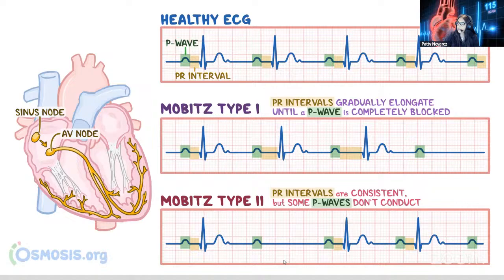However, there is a drop of the QRS. So if this were to start, look at this. We have a regular PR interval, a QRS a little bit wider, and then we have a T wave, and then we have a little U wave in there. But then we move back to the P wave and QRS with this regular interval, and then we have the T, the U, and then there's another drop. So that means here, for every 3 P waves, there's a drop of the QRS. So I hope that one makes a little bit more sense.